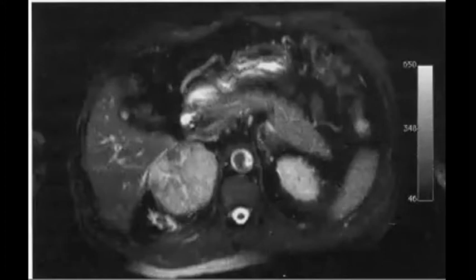Which one do you think? Ala? Okay, so what is the difference? Do you expect that the carcinoma will take uptake or not? Let's go again to the scan and see which one takes uptake.